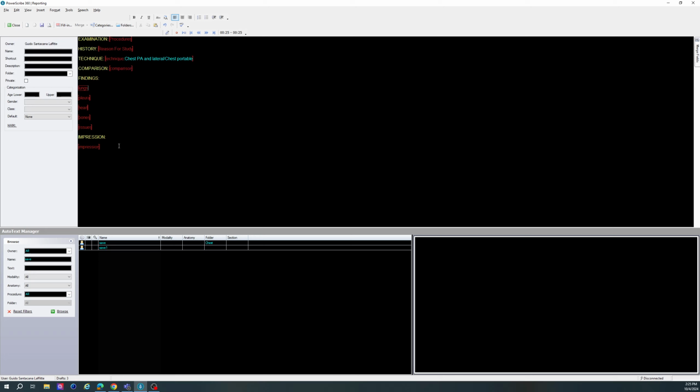So essentially, if you're looking at the chest x-ray and the only thing that it has is degenerative changes of the spine, you can say to PowerScribe, field bones, degenerative changes of the spine, no fracture, and that's it. And you can just sign the study and you're done. Because everything else, all the negative findings, are going to be there, and the study is going to be pre-populated. So it's much easier to create these templates in order to dictate studies more efficiently.